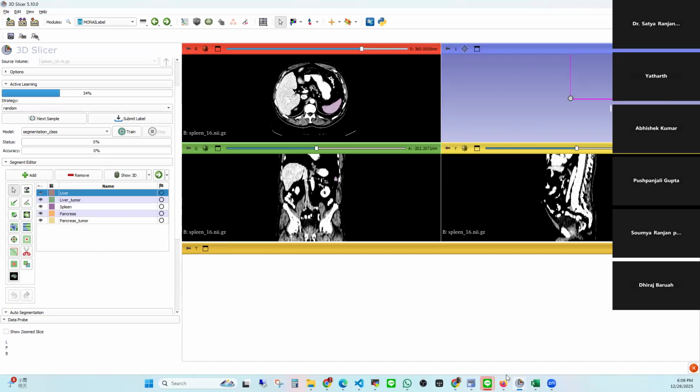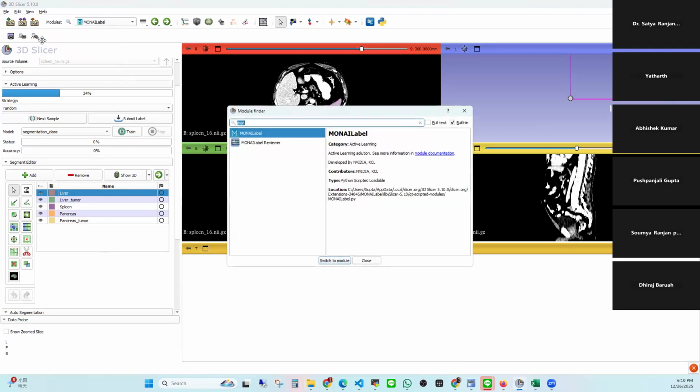So first I'll show the video, sorry, I'll show you the video first, how 3D Radiomics is done. I'll just show it here, it is better. So for this 3D Radiomics extraction, again, you need to go to another module. The one I mentioned last time is the Radiomics module itself.